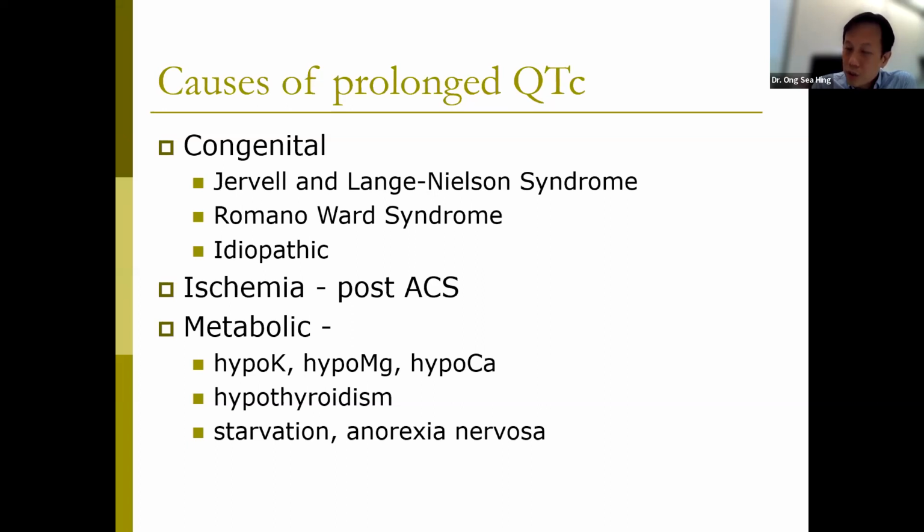It can be, of course, due to ischemia. So in patients with post-acute coronary syndrome, as well as patients with ischemic heart disease, you can get long QT. In hypokalemia, hypomagnesemia, hypocalcemia, hypothyroidism, and in this boy, the anorexic bulimic patient or the starvation patient, you can get prolonged QTc. Okay.